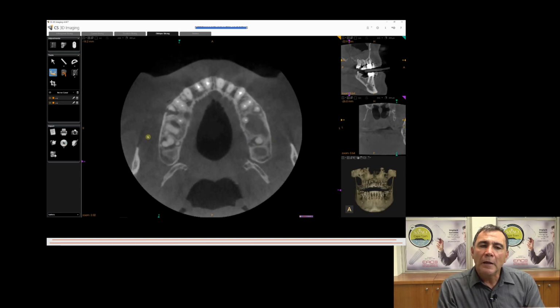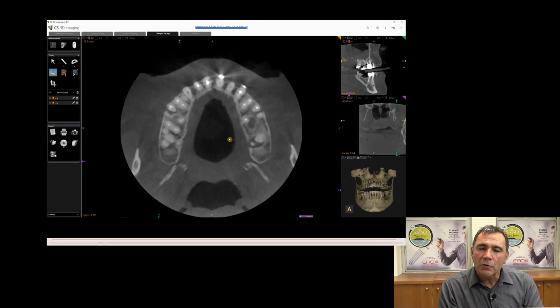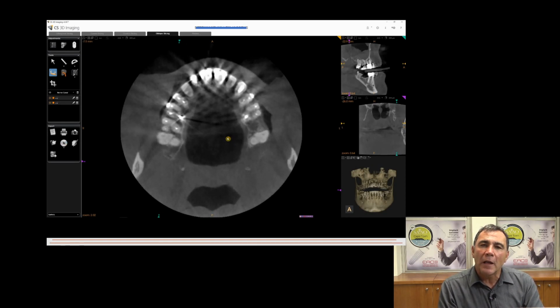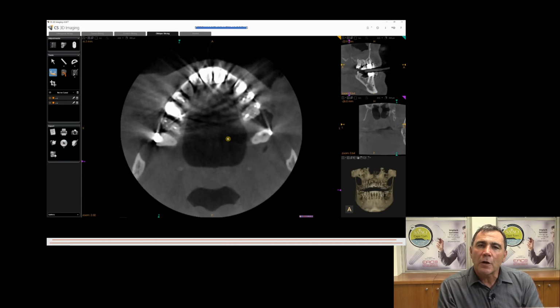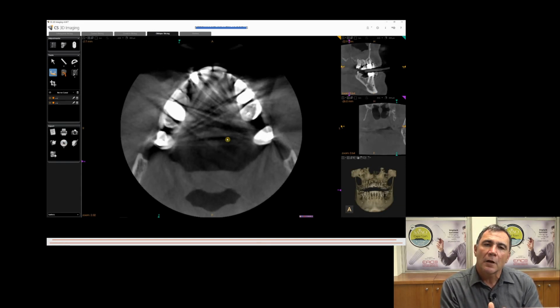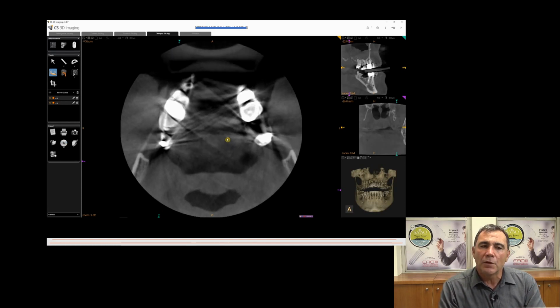So you see, and there in the 1-2 area, and I can start seeing more pathology. Now I need to know what's going on there, but don't go and look at it yet. You are going to come back to it. Make notes as you go on, because you need to come back to each and every one. And if you start jumping around, you haven't got a consistent way of looking at an image.